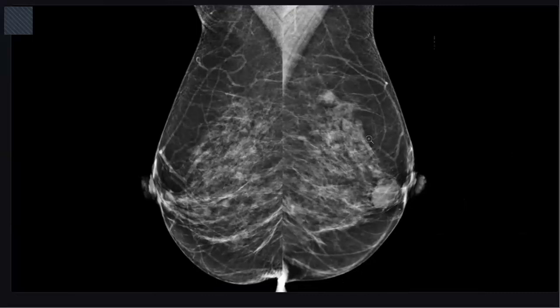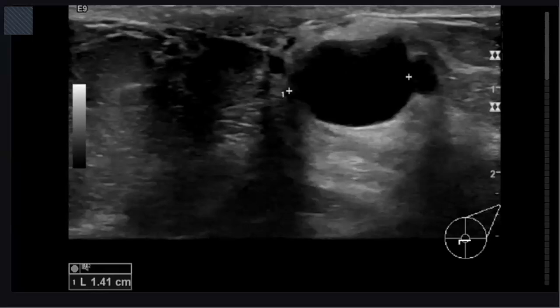If it appears clearly in the ultrasound and is accessible for biopsy, it will be biopsied. What are the differentials for this lesion? The differentials: it is an early malignant lesion. The other differential is a radial scar if this patient has any previous operations. This will be assessed in the triple assessment of the patient: clinical, ultrasound and biopsy if accessible by ultrasound.